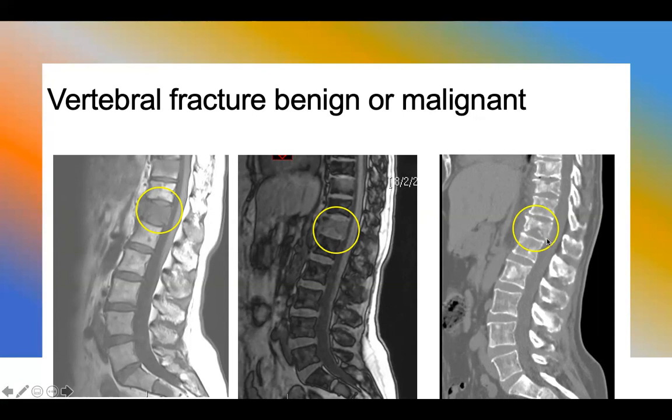As we said earlier, what we need to look for is this. When it comes to CT scan, it's quite ugly, a quite heterogeneous, mixed lytic and sclerotic lesion with some soft tissue component in the prevertebral soft tissues. On MR image, there is no loss of the signal intensity in the out of phase chemical shift imaging, and in T1 images, the signal within the pathological body is lower than the adjacent intervertebral disc, and it's quite lower than the adjacent muscles.